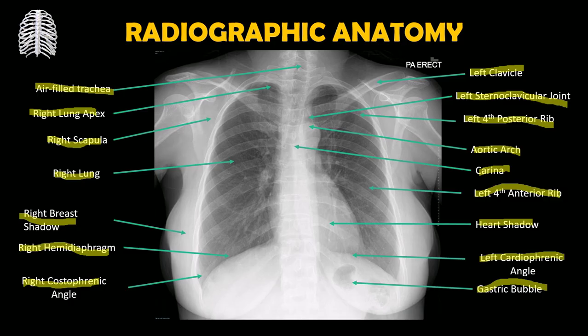It is very important for us to precisely identify the structures.